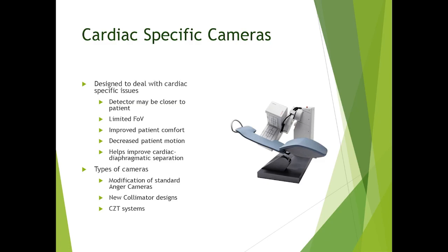The patient is therefore able to sit on a chair as opposed to lay on a table, so there's improved patient comfort, which results in decreased patient motion, and also improves things like cardiac diaphragmatic separation because of the positioning of the patient. So all of which go towards improving the patient experience, but also imaging of the patient and getting better scans overall. But there have been further developments of these cameras.